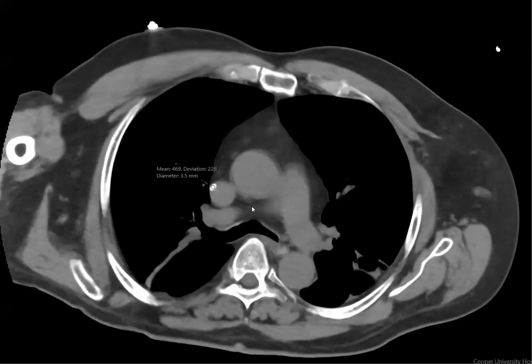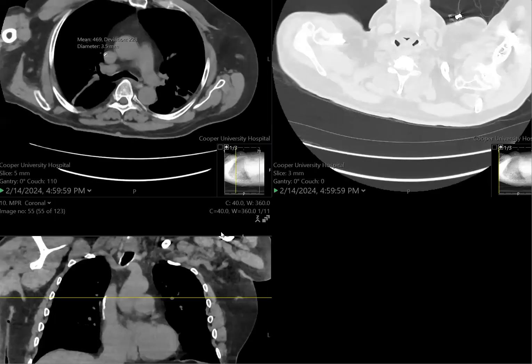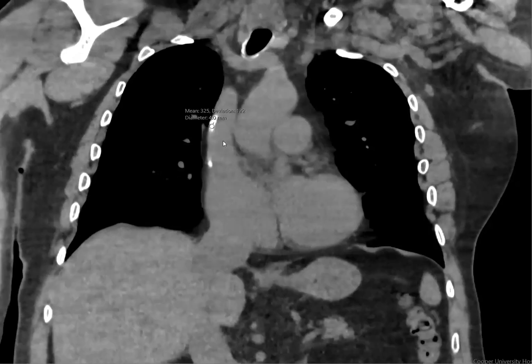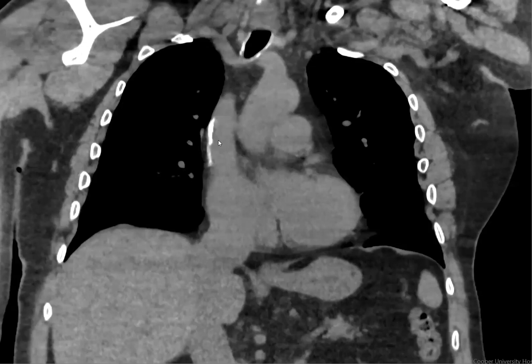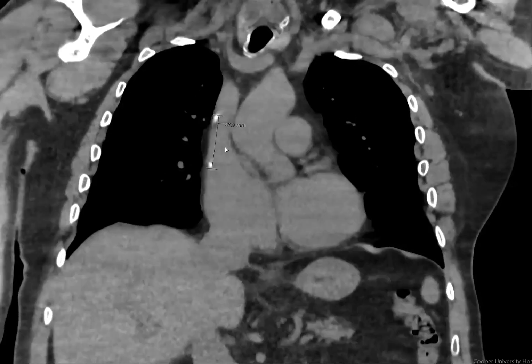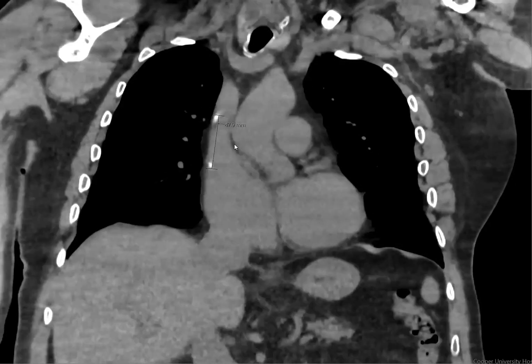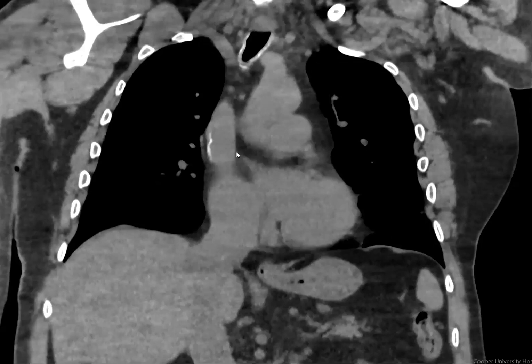Now, this calcified fibrin sheath can give rise to two common complications. One of them is if this calcification gets big enough, because once there is dystrophic calcification, there are chances of it accumulating more calcium over time, and this deposited calcium can become so big in size that it can cause vascular occlusion. So that's one complication that can happen.